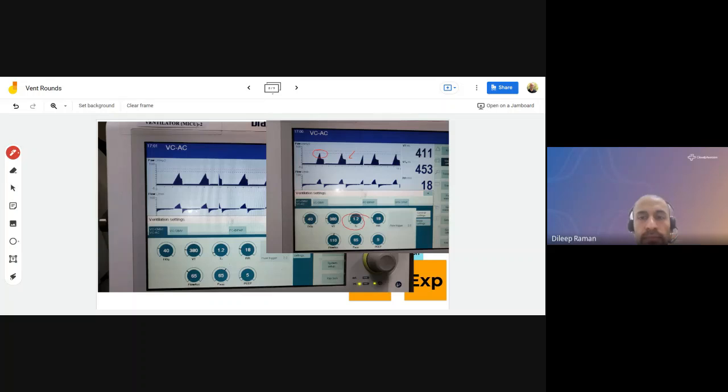Is there any possibility that the Pmax, why is the ventilator going till the Pmax? Could it have changed even before reaching the Pmax? So it didn't reach the Pmax. The Pmax is the red line. On the Draeger ventilator, typically it starts to kick in the alarm about 5 to 10 below the Pmax. That's why they are showing two dotted lines, and this is there in the manual. You will be able to see that.